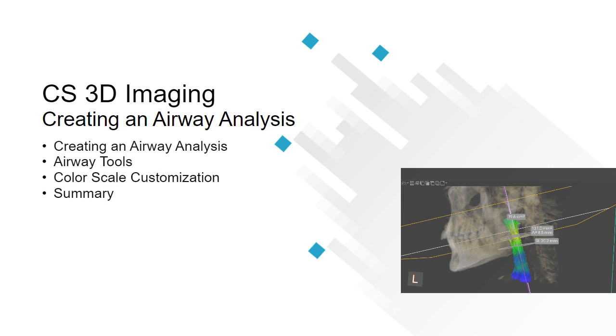CS3D Imaging, creating an airway analysis recorded class. This recorded class is designed for ENT, sleep apnea and orthodontic team members. It provides the workflow to create an airway analysis with distance and volumetric measurements.